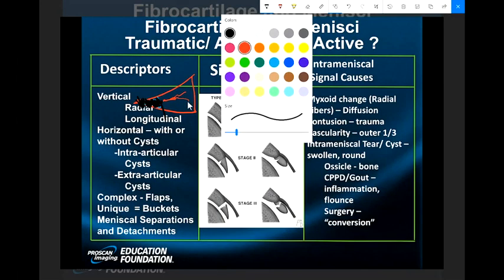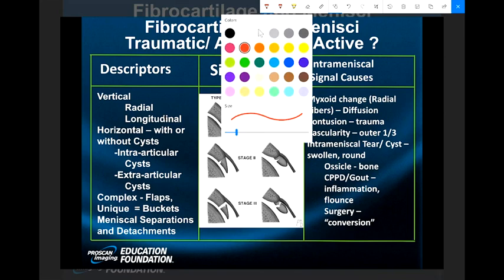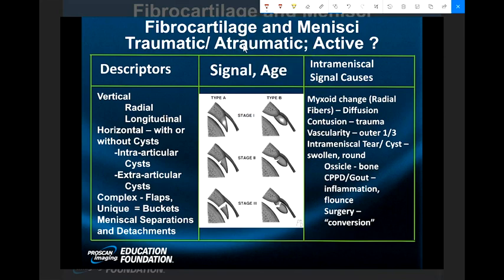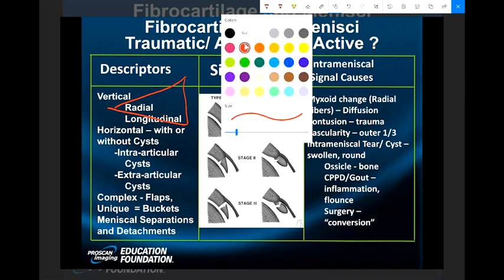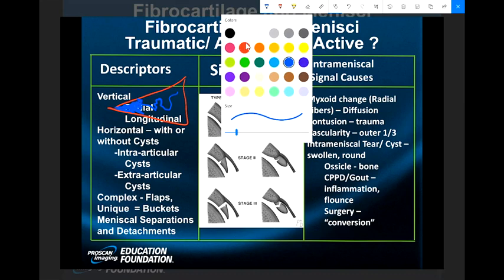Well, we're not done yet. All right, let's do it again. Remember, this is going to apply to any fibrocartilaginous structure. So now I've got my meniscus again. This time I have a really big tear. Got this really big blue tear. It's like this. Then it's got a radial component. It's just nasty. And the surgeon goes in there, and what do they do?